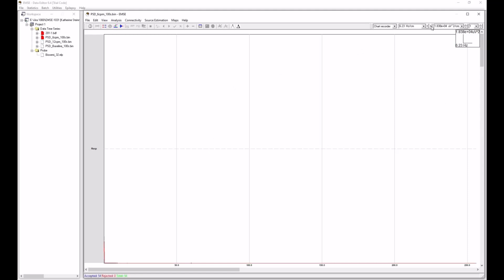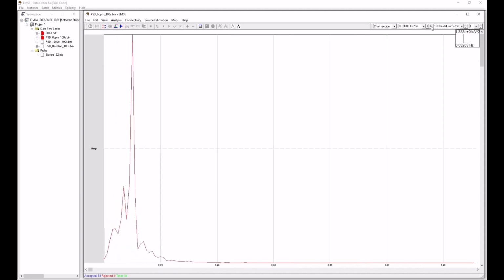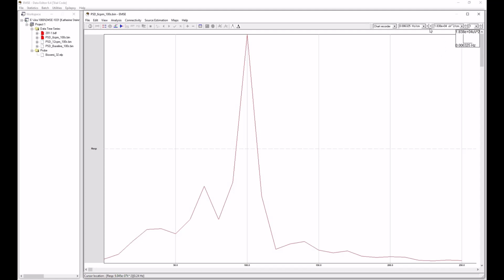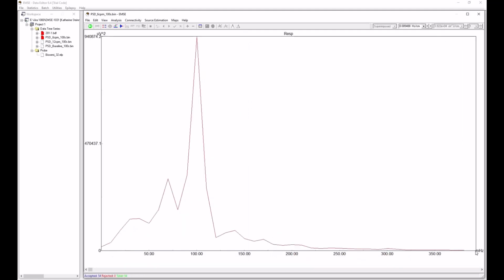And we've got a long range, so we really want to zoom in. I see this right-click arrow. I just really want to zoom in to the very, very low end of the spectrum here. Now notice, if I zoom in on that, we're in millihertz already. These are slow frequencies, which are perfectly appropriate for, say, fMRI and slow-paced breathing.